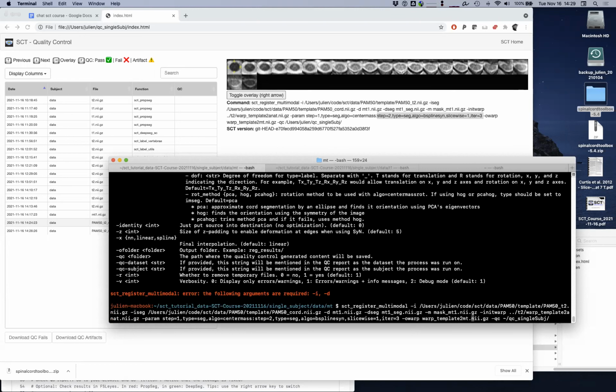Right. So let's call it empty im. In this case, I'm going to keep this one, but for step 2, we're going to use im. Okay.